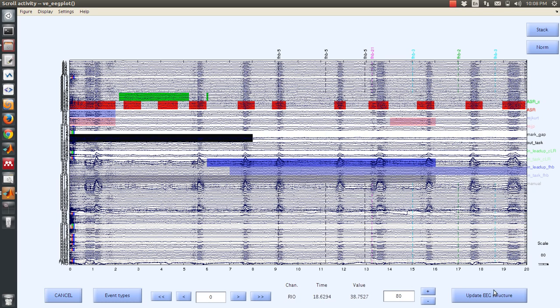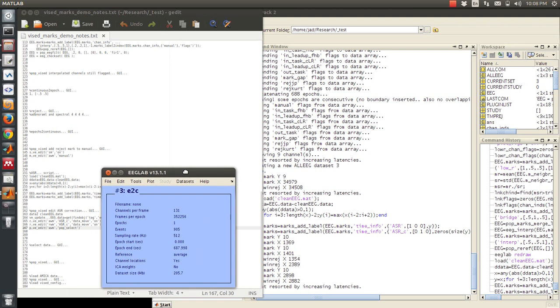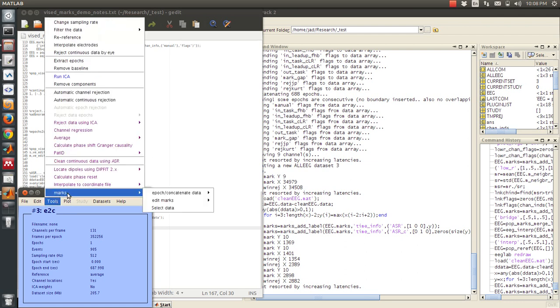And then from there, if any changing of the data is done using this interface, whenever I update the EEG, it knows to collect the right data back from the stream. So at this point, the key is really trying to keep the mark structure of annotations compatible with the size of the data array, so that the indexing will work. So there are tools for selecting data based on those structures.